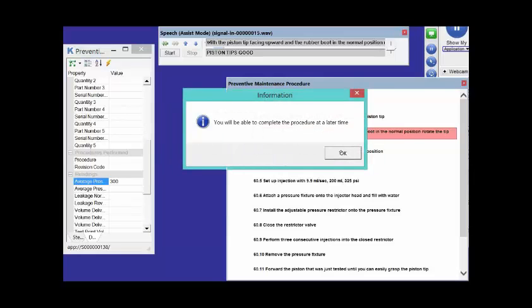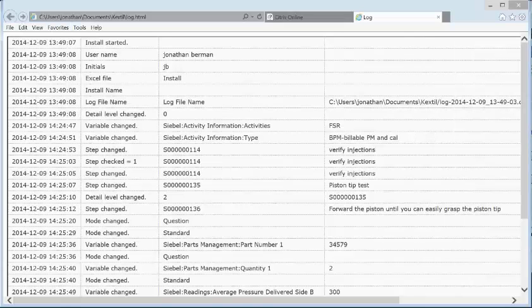So if I shut this down, I'll give you a quick glimpse into the vNo. So this isn't super user-friendly today, but down the left-hand side of the screen, left-hand column, you see timestamps. And the columns to the right are all the activities that just took place in our service event. So the event is fully documented. The minute it's over, I push the last button, I turn the last screw, I close the cover of the machine, what have you, and you have an incredibly rich documentation that didn't take any time to capture.